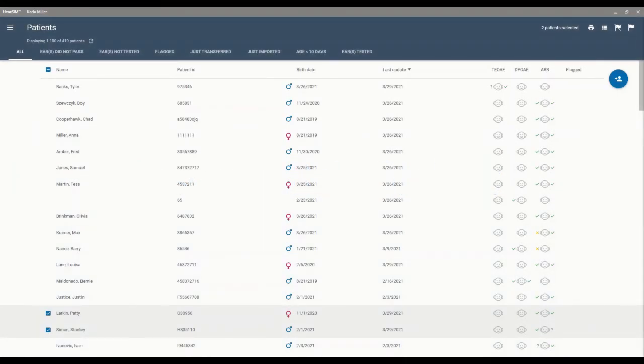If you've imported patient names from HearSIM into your screening device, you can take the device to the baby for screening. You choose Select Patient and find and then select the desired patient name in the device list. You'll see the information that was transferred from HearSIM. If you discover that some information is incorrect, you can fix it on the device, but you must add or edit the information before performing the screening.